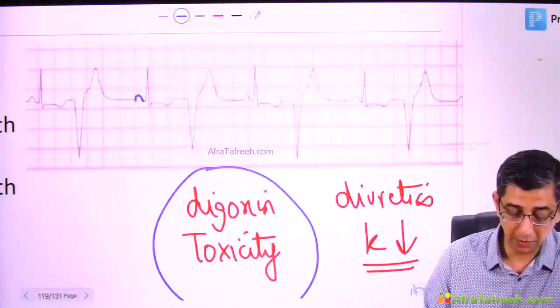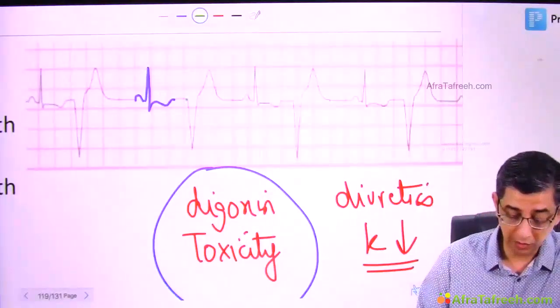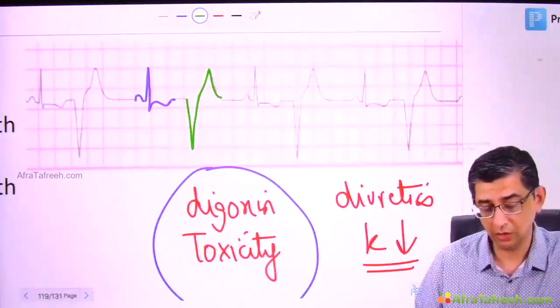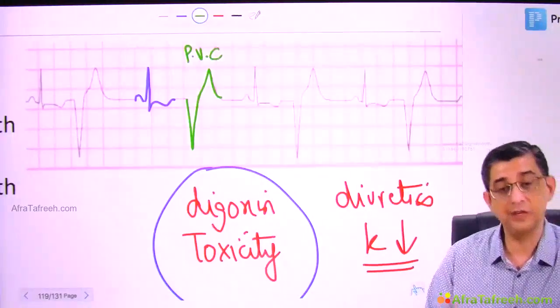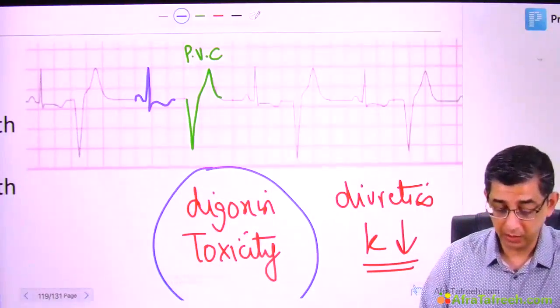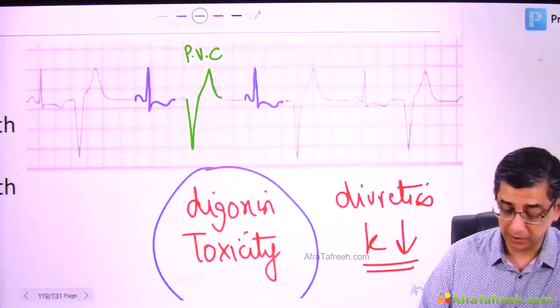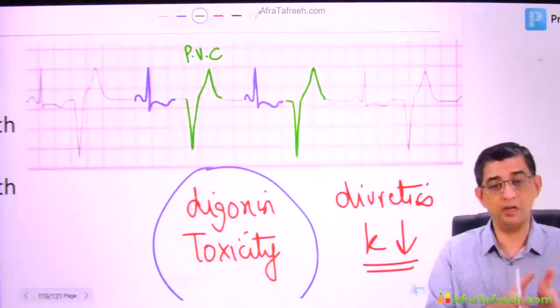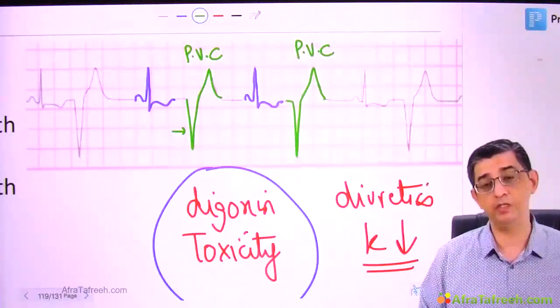You will notice a very characteristic P wave present, then a QRS complex with a slight T wave inversion. After which you are noticing the presence of a really broad QRS complex, this that I've highlighted before you, which I can call rather a QR complex as well, is a premature ventricular contraction. The ventricle is getting depolarized early and then is contracting also early, though it will be an ineffective contraction. Then again there is a normal sinus rhythm with a mild T wave inversion that could be coming because of digoxin, but then there's again a very deep Q followed by R. Everything that goes down before the R wave is going to be a Q wave only. This is a premature ventricular contraction. There's a big septal activation happening and then there's a ventricular contraction.